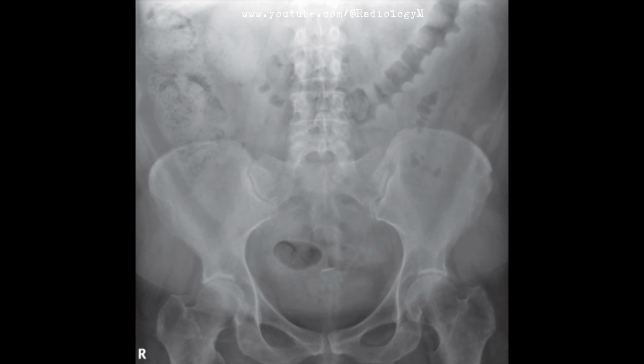Ischemic colitis is another differential diagnosis to consider, especially in older patients or those with vascular risk factors. But the distribution here suggests a more chronic inflammatory process rather than an acute ischemic event.